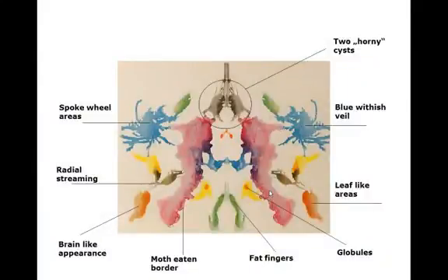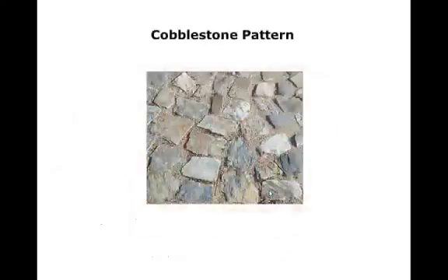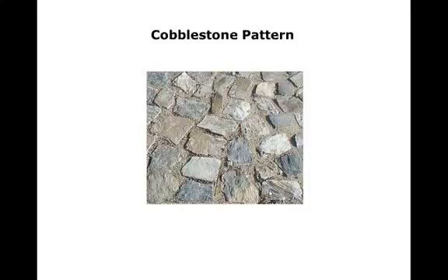This is a little bit like a Rorschach test. But the Rorschach test was not developed to describe pigmented skin lesions by dermatoscopy. As you know, it was developed for other reasons. And we have other metaphoric terms in dermatoscopy that are difficult to understand for someone who is new to the subject. For example, cobblestone pattern.